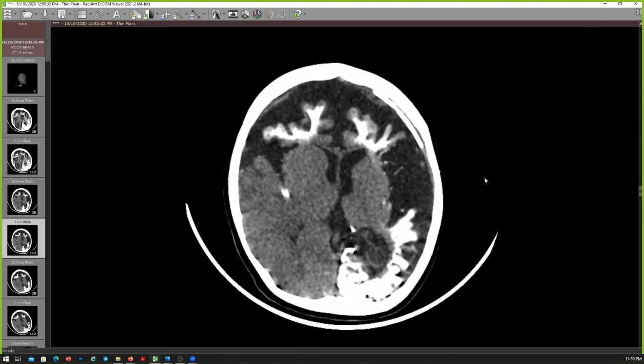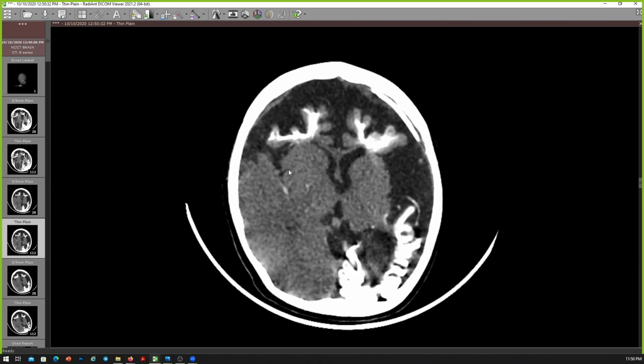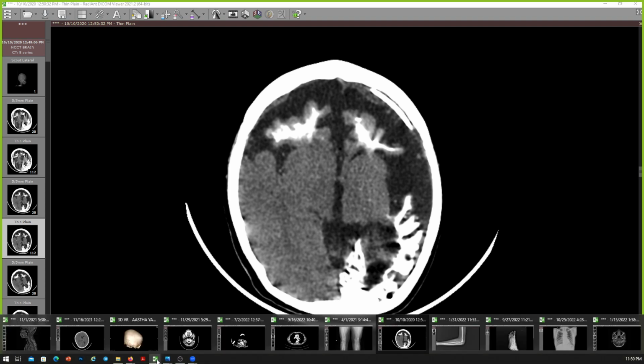And on the left side, you can also see enlargement of the ipsilateral choroid plexus. It is an advanced case, and there is development of some gyral calcification on the right side as well. Yes. So we've done this case, and I think we've left with one case.